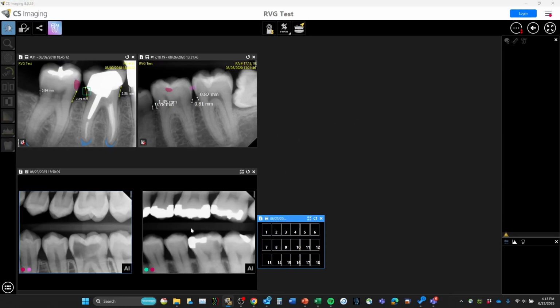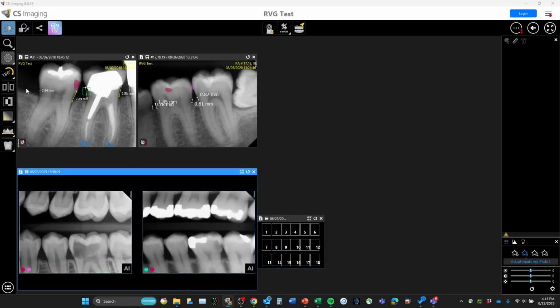Just ensure that if you are in one of these formats, if you do see that 90 degrees rotation is grayed out, that you hit your little drop down here for 180 degrees, and there you go.